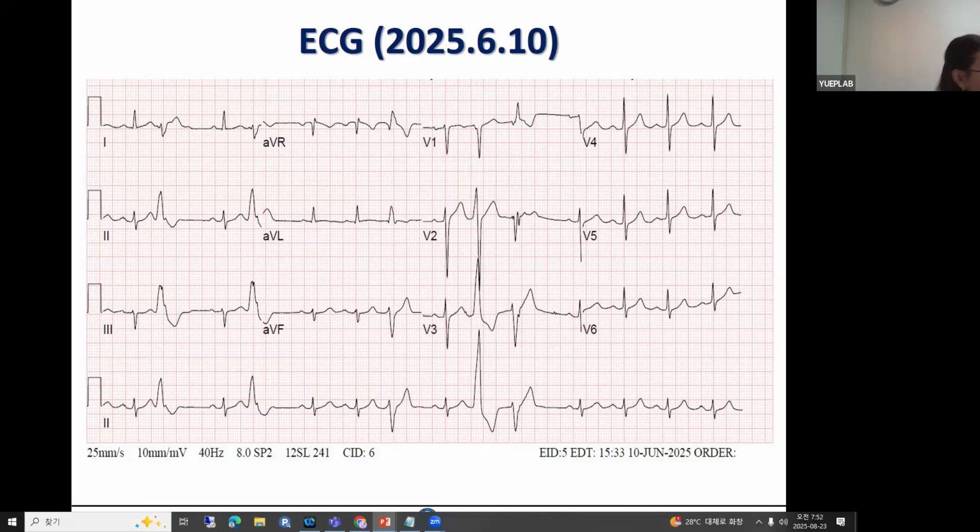Yeah, I think this one and this one are the same. I think so. But the T wave morphology is slightly different from this one. Yes, and there might be a P wave at the top of this. So this and this and this are, I think, PVCs.